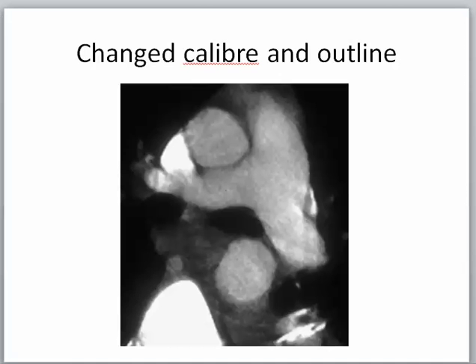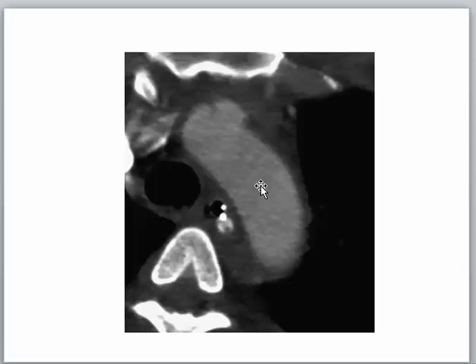and the relation of trauma will be seen here. Now this part is called a hidden area because it is covered by this. I mean, it is anterior.